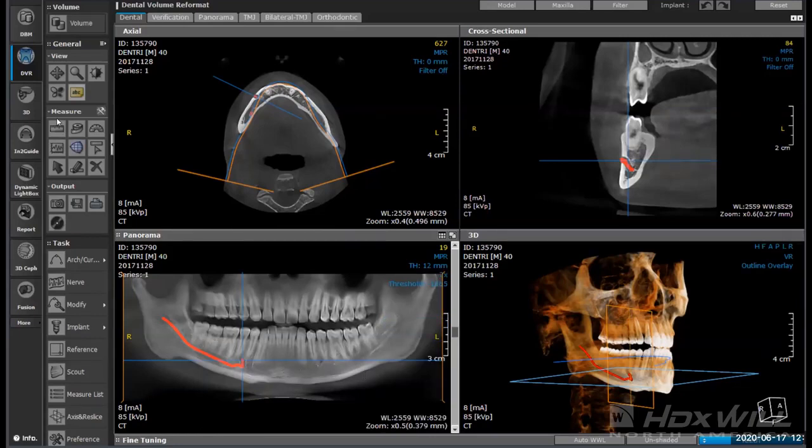We went through the 3D examination of number 30 to look at the structures, and know that we have an undercut that we're going to be dealing with at some point. So again, going from 3D to DVR is important. So we assess where the implant's going to be and what we're going to do with that implant once we get there. So in this case, we want to move right over to 30.